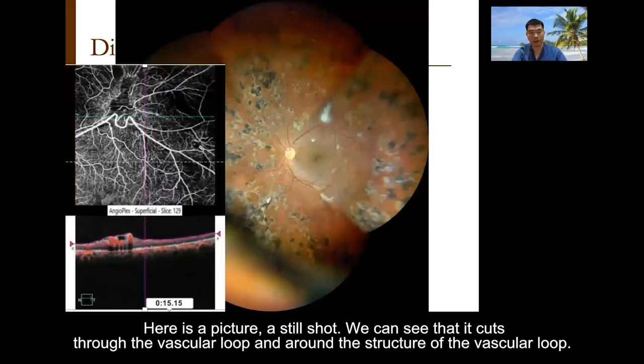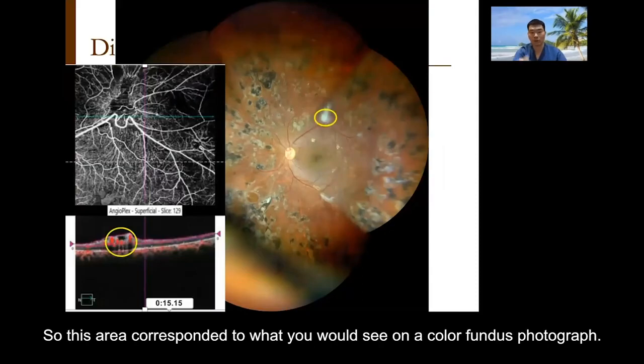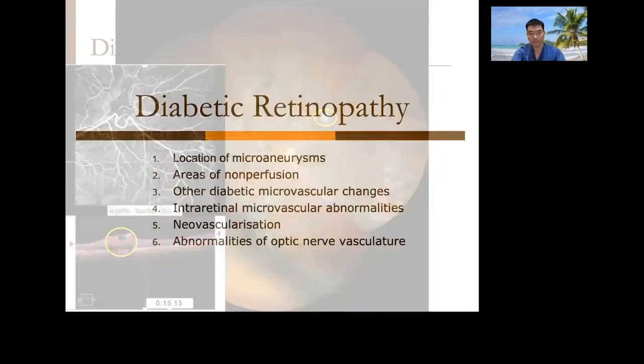Here is a still shot, where you can see that it cuts through the vascular loop, and around the structure of the vascular loop, we can see this protrusion with increased blood flow. So this is the area corresponding to the white area that you see on a color fundus photograph, the fibrovascular membrane, indicating this patient has NVE, new vessels elsewhere, with increased blood flow on the OCT-A, as you have seen.